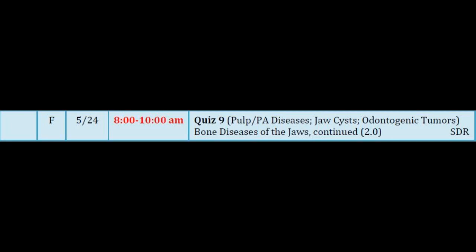Here's one in the anterior mandible that's crossing midline, and it looks like it's maybe slightly multilocular, but even at the edges, there's no bone reaction. There's no cortication. So for an absence of cortication with a pure lucency that's expansile, one of the things you want to consider is central giant cell granuloma.